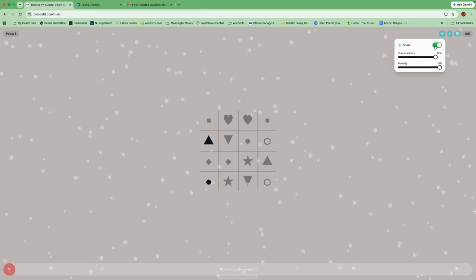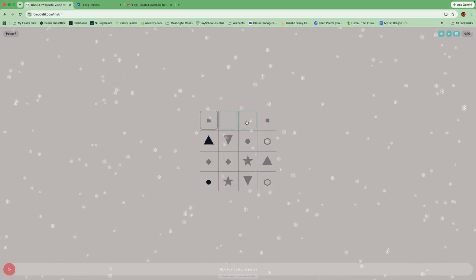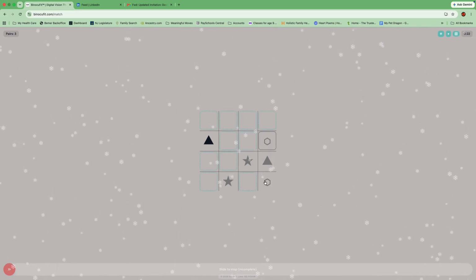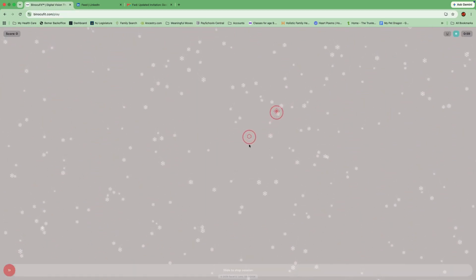And we can add the snow if we want, okay? So this is about 50-ish% contrast. This would be useful if you had somebody where you didn't feel like you wanted to be training in the red-green mode, but you still wanted to build in their sensitivity. You can take it all the way down there. And we'll continue over here.